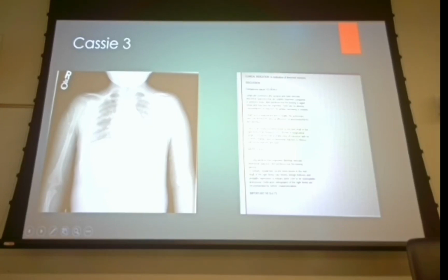I think though, I have to read back through this, but I think what we're looking at over here is what looks like a cyst. Solitary expansive lucent bone lesion mid-shaft to the right. It's a femur. Femur? Really? This guy went to 12 years of school and can't distinguish femur from a humerus. But anyway, it's probably a bone cyst.